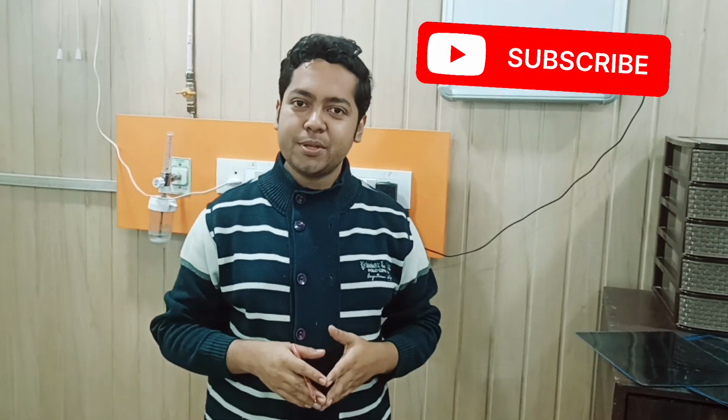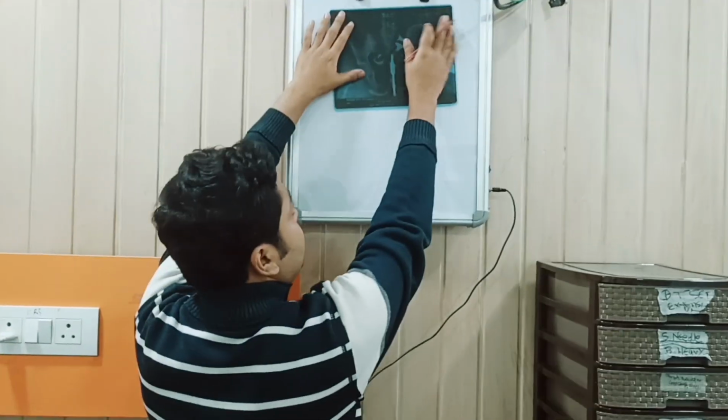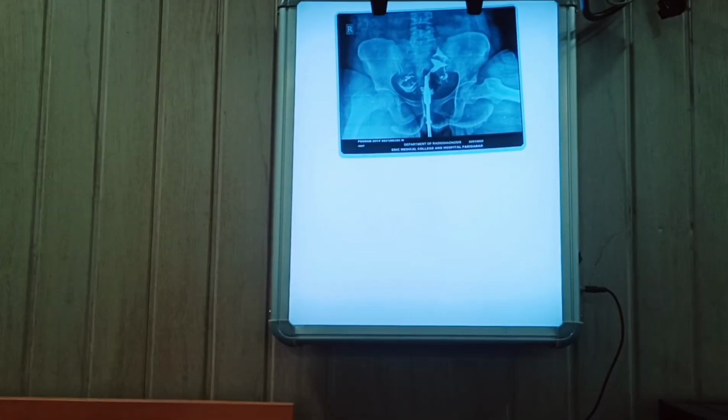Hello friends, in today's episode we'll be talking about HSG, hysterosalpingography. In exam you generally get a film of HSG.